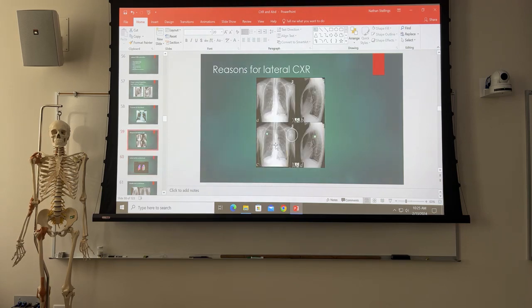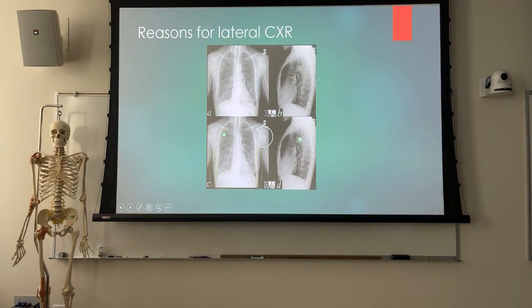So on an x-ray, in this one, go back to full view, on this one, they're pointing out this fracture over here. It kind of looks like an older fracture, but looking at this pathology here, all the way up here, if it's more posterior, what would that indicate? It's in the far upper portion of the lower lobe, right? So again, it kind of gives us a better dimensional perspective of what it is that we're looking at and where a particular pathology is.